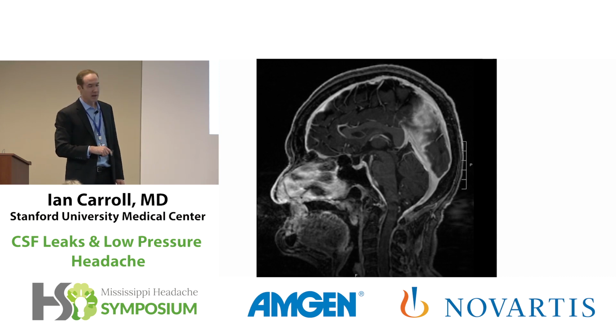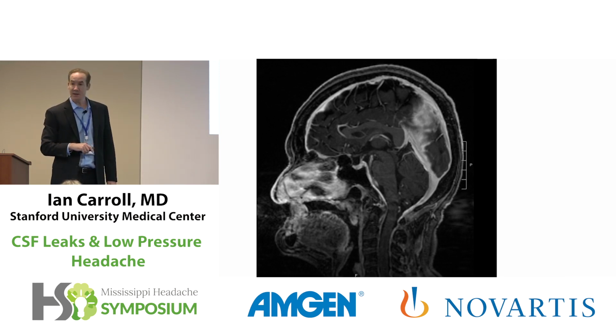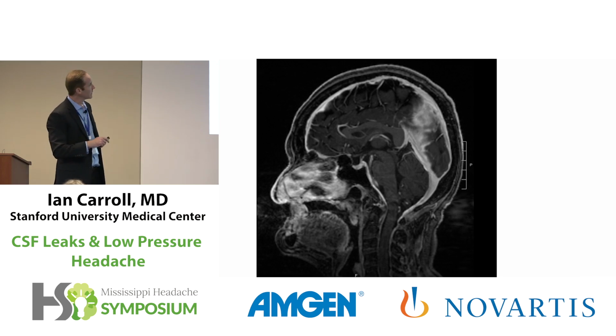You only see this on a contrast-enhanced MRI, and it's a function of the fact that when the pressure inside the skull drops, the veins and the little venules in the dura distend, and if the veins are currently carrying gadolinium contrast, then you'll see this kind of contrast enhancement. Perhaps a little more subtle is that the pons here is bent up a little bit towards the midbrain, what's called beaking.